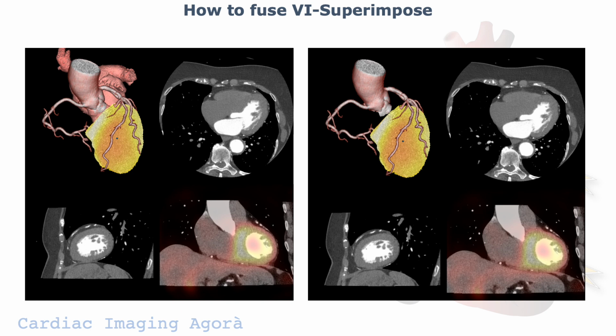Most importantly, in this example, the left atrium as well as the pulmonary arteries. Basically, structures that are close to the region of our interest and have bright contrast enhancement are also included in these models. The good thing is that these models can be easily removed by just unclicking them, and you get to the final result on the right.